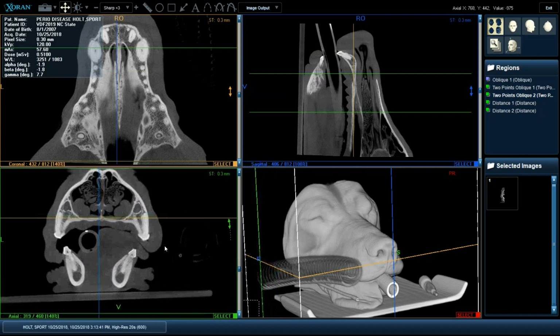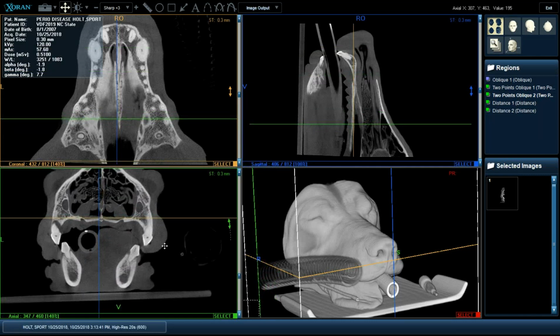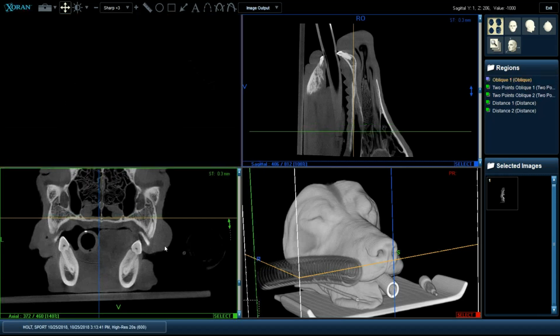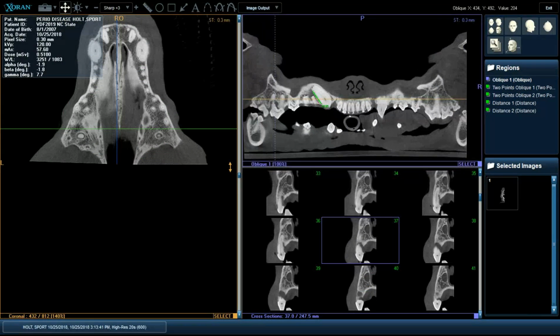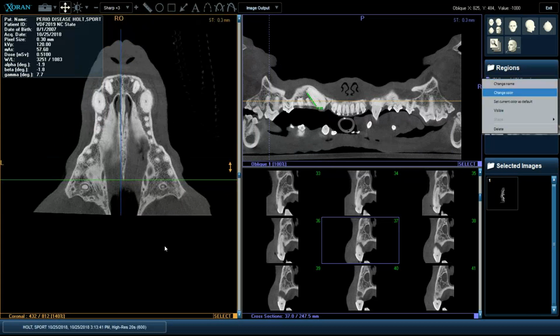We would then, after we've quickly seen a few problems here and there, here's one of that same defect again, we would then go ahead and trace the panoramic view, which would show us some of those defects, in particular this one isolated defect.